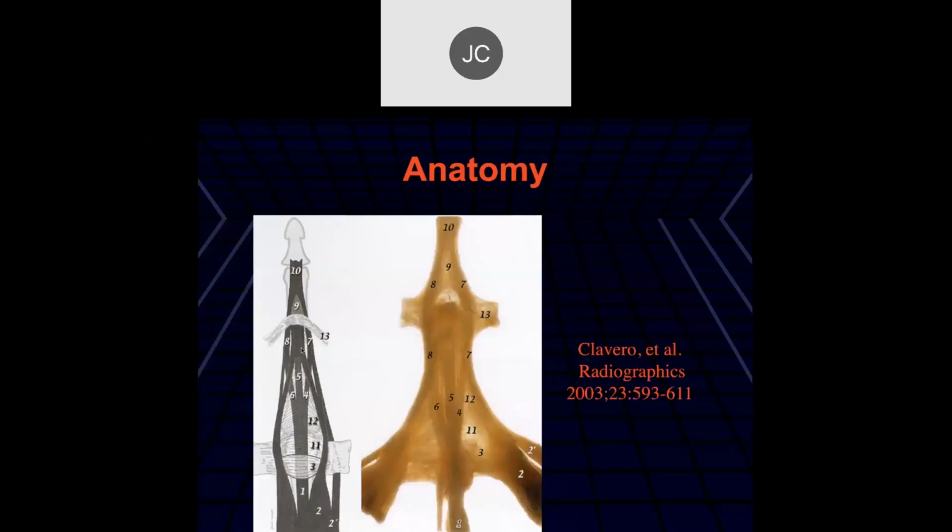Again, to remind us of the complexity of the anatomy here, here's that extensor tendon that comes down. It trifurcates. The central component slip inserts on the base of the middle phalanx, and then the lateral processes go around the central slip insertion to combine again distally here.